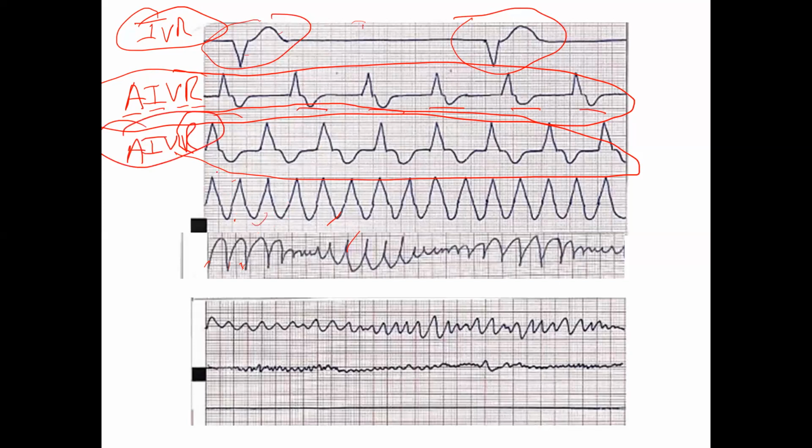This one you should know right by looking at it. This is the one EKG I'll let you look at and call it. And this is like 150. Tachycardia? What is it? Ventricular tachycardia. Yes, please know this one. This is VTAC, right?